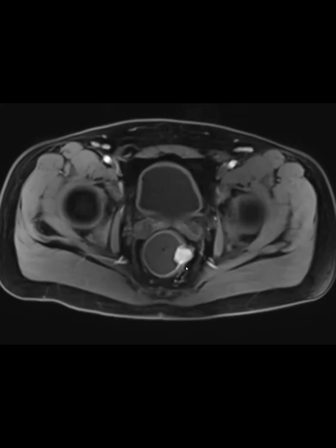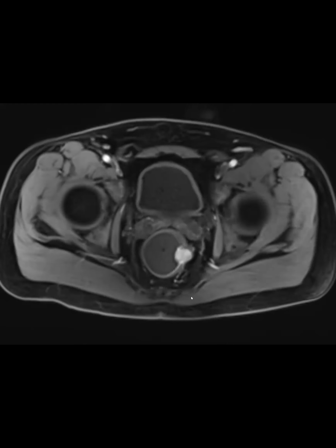So a lot of the rectal protocol MRs that I've read for rectal neuroendocrine tumor, I don't see anything because they found it incidentally in colonoscopy. They resected the whole thing, and now they're doing the staging MR, but you don't really see anything left there. So that's the much more common scenario when I'm reading these MRs, but this was a much larger one. So they're actually planning to do an LAR here.